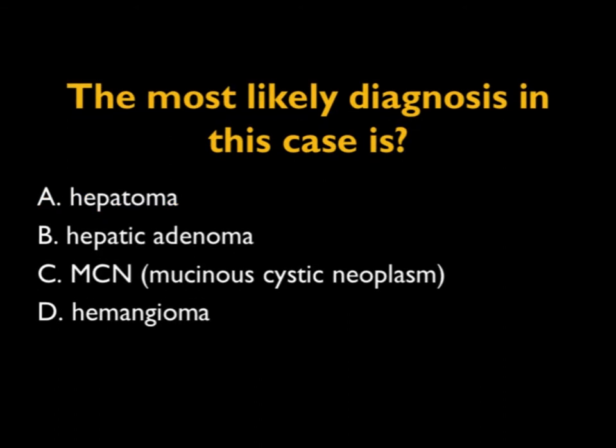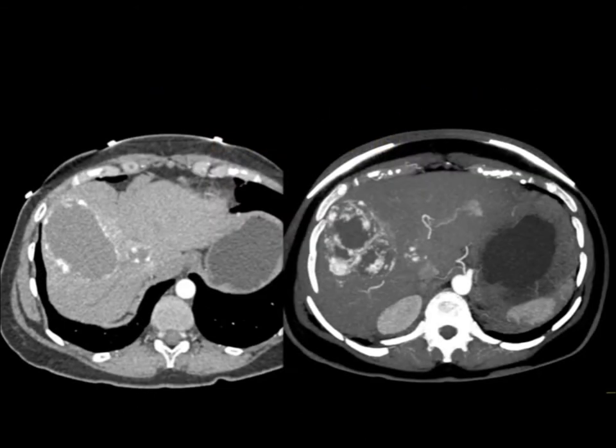When we speak about enhancement patterns, we always say look at liver lesions and look at enhancement patterns. In this case, you can see on both the axial images and on the MIP imaging that the patient has a lesion in the liver, which is large, about 8 centimeters, but it has peripheral enhancement. And on the MIP imaging, you particularly can see the puddling. You also can see an additional lesion in the left lobe of the liver.